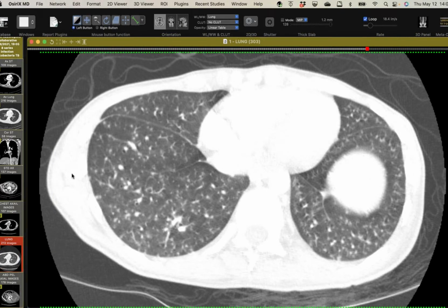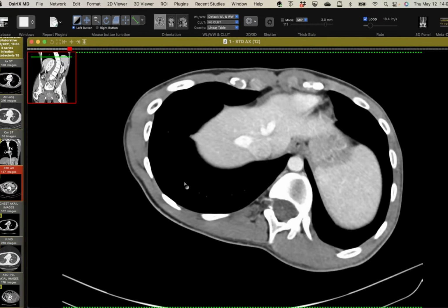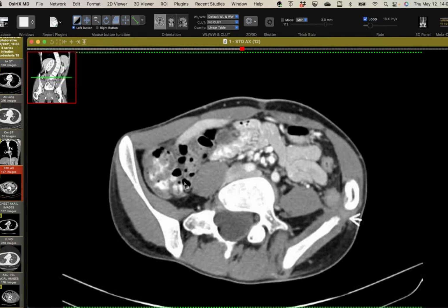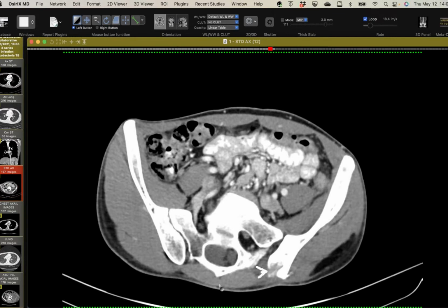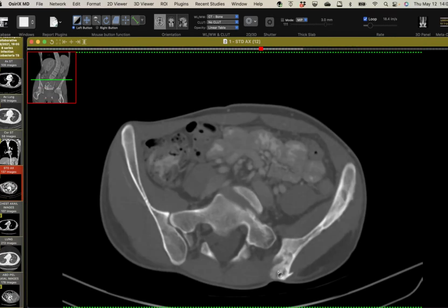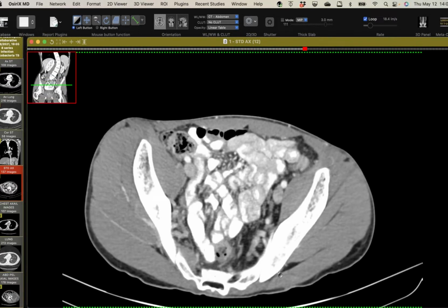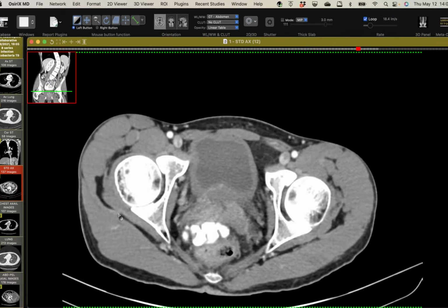I have no intermediate imaging, but this was his most recent imaging after completing therapy. And you can see that the abscesses have been drained. There's still some bone erosion, but on the bone windows, you'll see that there's sclerosis. It's healing. And these are about a year apart, a little bit more than a year. So that's that.